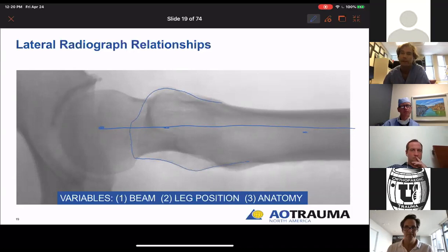Now, in pertrochanteric fractures, the greater trochanter is often multifragmentary, and so this is difficult to assess, and it may not be in line with the head, neck, shaft collinearity, which creates problems when your starting point is not on the greater trochanter, right? So I want to think about that for a second.